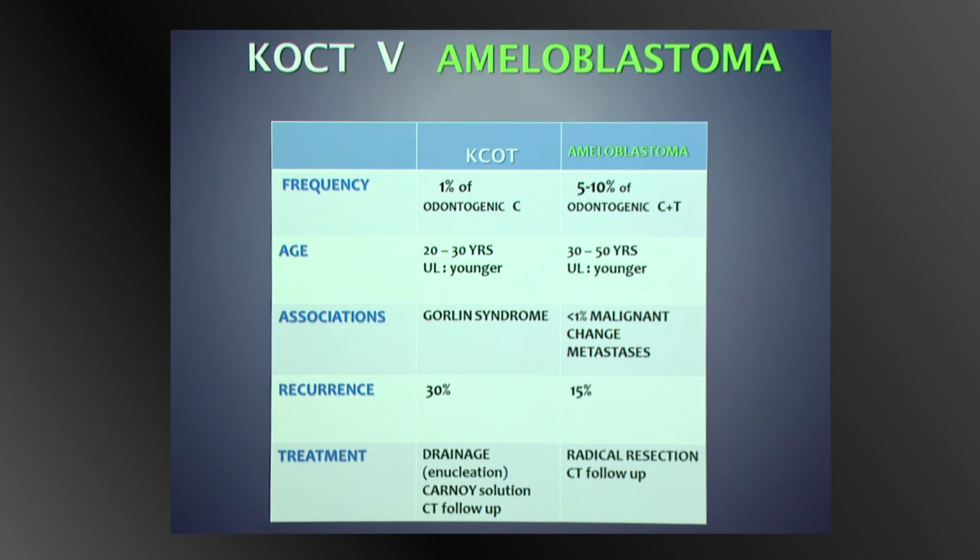So this is what used to be called an odontogenic keratocyst. And they've now been reclassified as a tumour in 2006 and given the name of keratocystic odontogenic tumour. The major differential is the ameloblastoma.